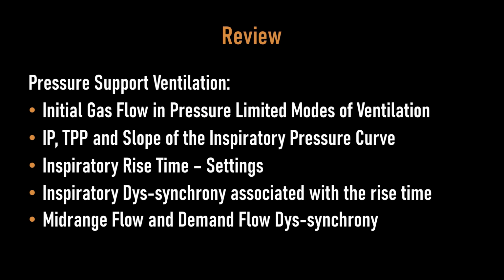Let's review this tutorial. In this tutorial, we looked at the start of the breath and the initial gas flow in all pressure-limited modes of ventilation. We looked at the inspiratory pressure, the transpulmonary pressure, and the slope of the inspiratory pressure curve. We introduced the inspiratory rise time and the settings that one puts into the ventilator. And then we saw how alterations in the rise time may result in patient ventilator dyssynchrony. Finally, I looked at mid-range flow and demand flow dyssynchrony.